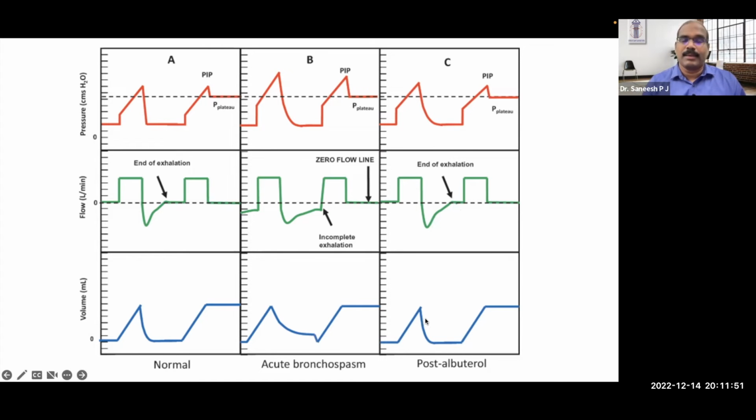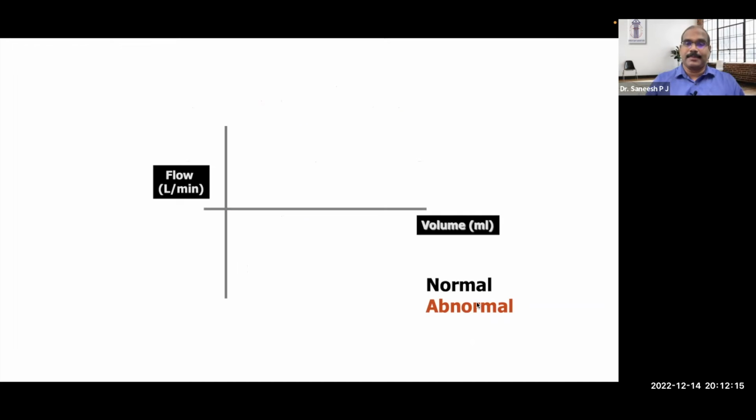And of course, the volume delivered may improve depending on what was the impact before that. So again, the graphics will help you to identify things, institute your corrective measures, and see in front of your eyes what changes are reverting back to normalcy or baseline.